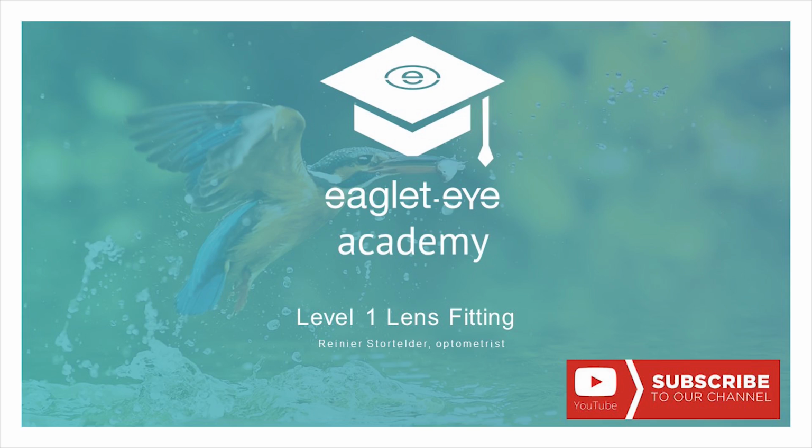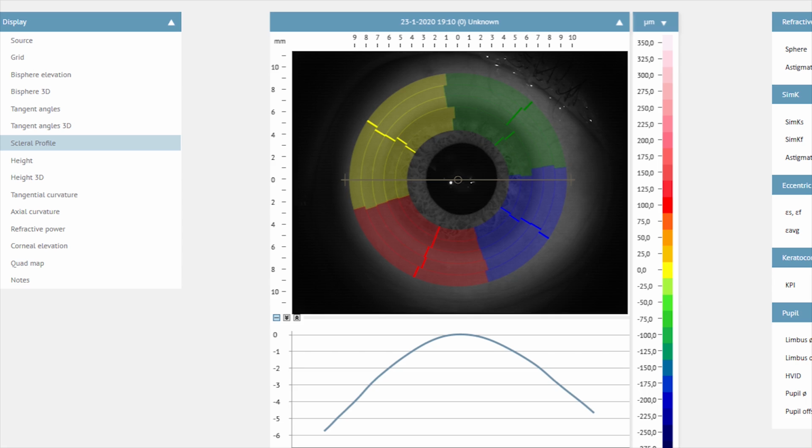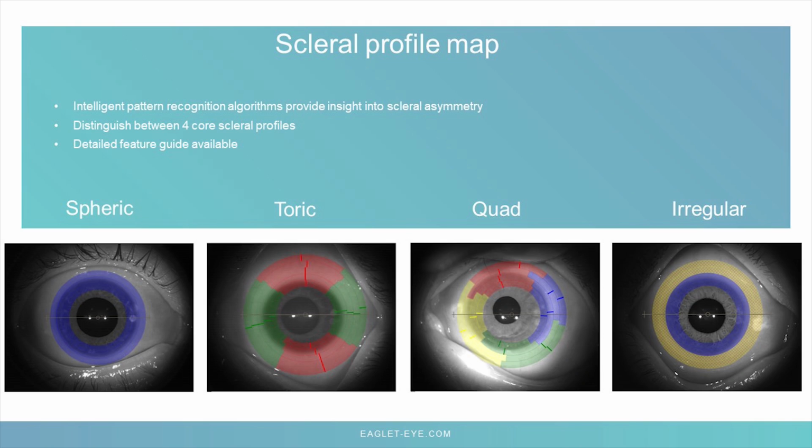In this video, I will use our Scleral profile map as the basis from where you start thinking about what type of landing zone you can design. After you've checked the quality of the measurement, it is recommended that you start by checking out the Scleral profile map. You can find 4 options: spheric, toric, quad, and irregular.